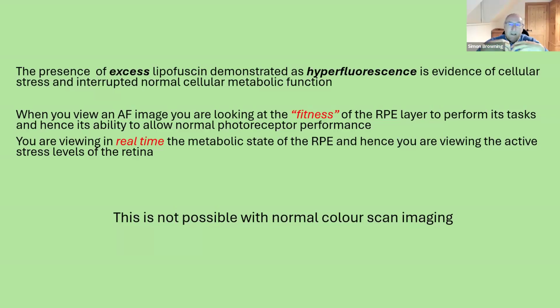And that's why we should be looking at a structural image and an autofluorescent image at the same time, because often you will see in that autofluorescent image something which you cannot see on the other image. So let's look at some causes here.